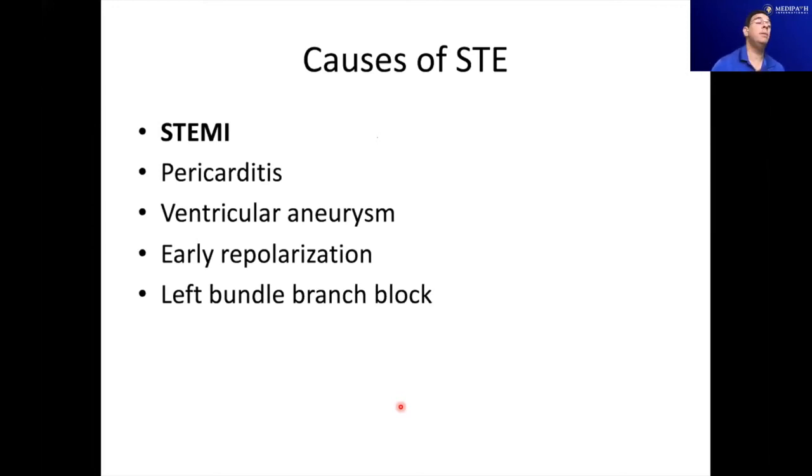So in the emergency department, or even if you're on the floor, if someone has chest pain, we do an EKG. One of the most common reasons we're doing it is to look for the cause. And you're looking at causes of ST elevation, okay? The most common cause of ST elevation that's treatable and dangerous is something called ST elevation MI, myocardial infarction or heart attack with ST elevation. Those patients are amenable to either TPA or going to the cardiac cath lab and getting an angioplasty or a balloon, oftentimes with a stent.